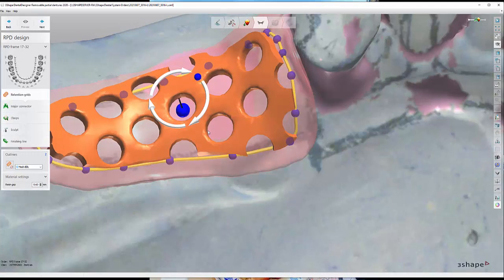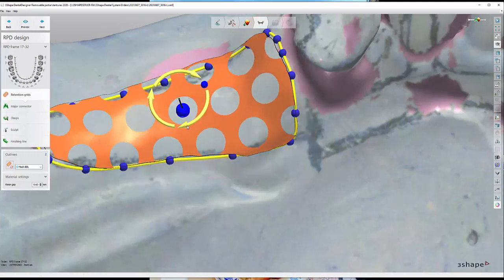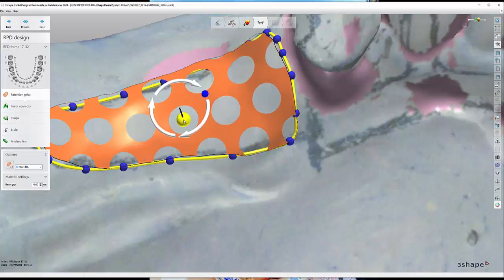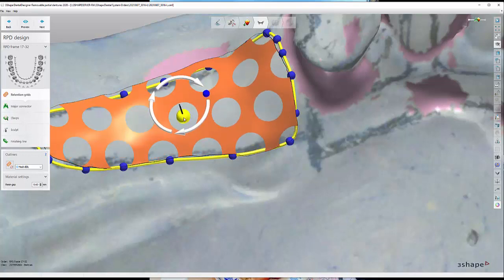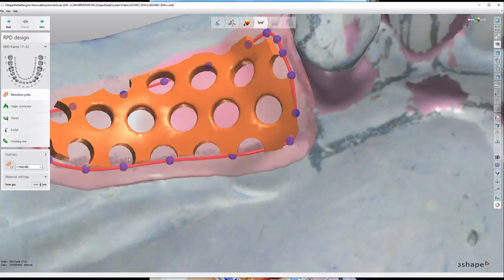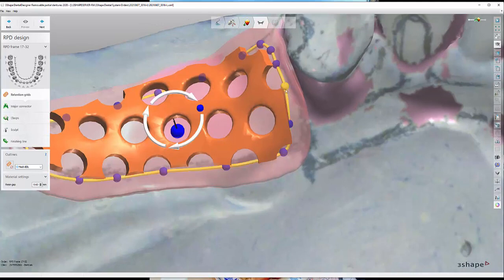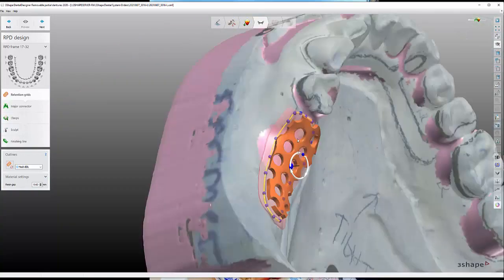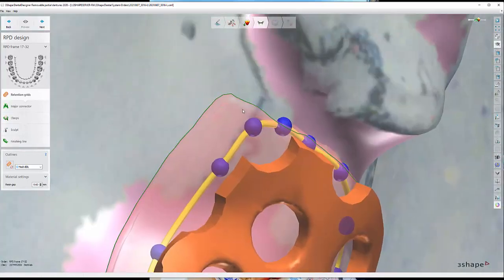So when we do these cases, all of our saddles, we basically do like a mesh, kind of get this hat, so they're half holes. We rotate this so that when we come back later and fill this leading edge, it's real clean. So I bring this sheet relief back, or resin gap as 3Shape likes to call it.